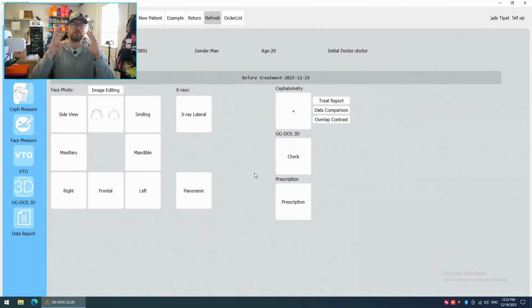Now, that's the beauty of this. Right now, the design center is in China. And the best thing about that is while we're asleep, they're working. And while they're working, we're asleep. So you upload these one day, and then when you come back the next day, they're done. And I actually get an email from them that says, hey, your design has been completed. Go check it out. And so that's what we're going to do now. So I've already sent these. I don't know if we'll get through all these or not, but we'll just go through these.